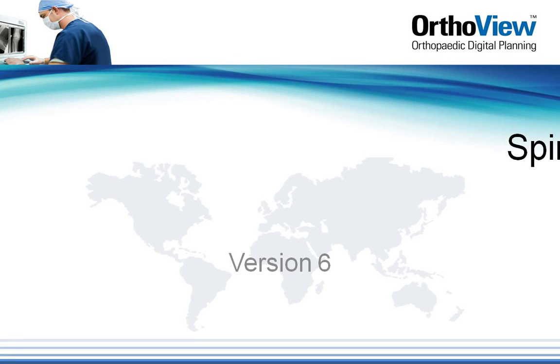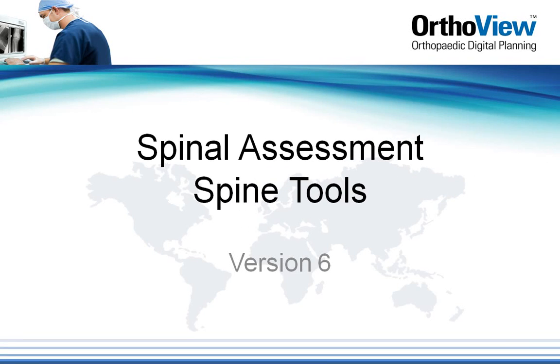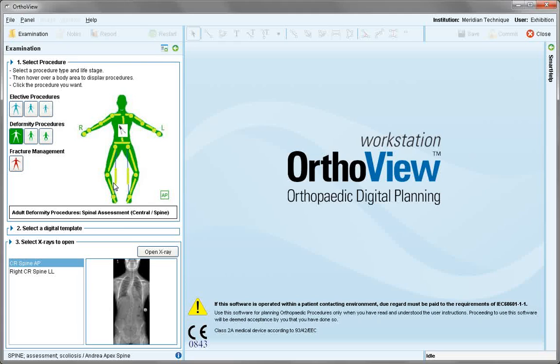In this tutorial, we review the spine tools associated with the Spinal Assessment module. With the images required loaded, choose the Deformity Procedures module, hover over the spine, and choose the planning icon. Select whichever image is of interest and open the X-ray.